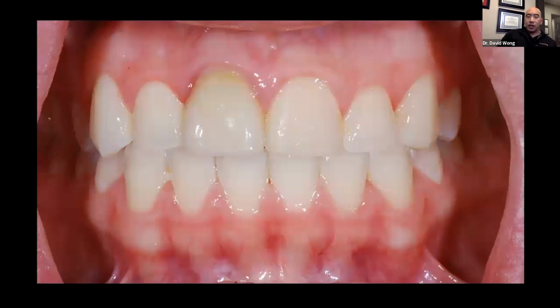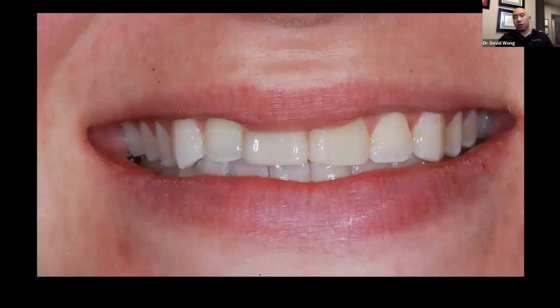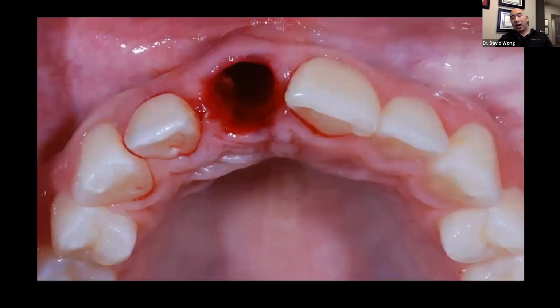Another one. In a situation like this, I told you earlier, generally speaking, if a patient has recession, you generally don't do an immediate implant, which I stick to, by the way. This is an older case, but when you look at the CBCT, you're going to see that this has a facial plate and a really nice lingual plate as well. She has a super low lip line, and honestly, that's probably what dictated our thinking more than anything. If she had a high lip line, I would have told her just to stage the case.